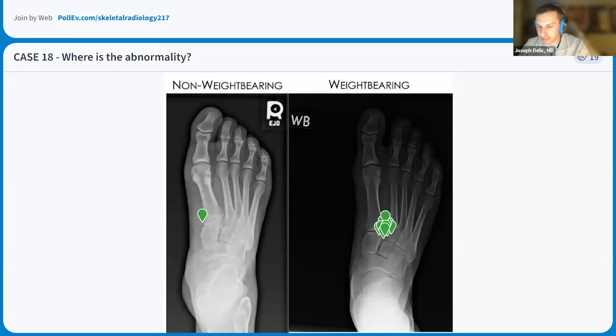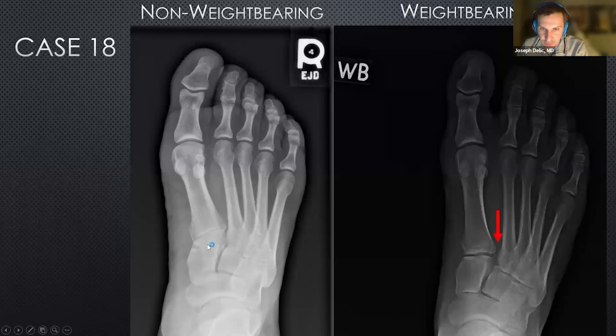Okay. So we look at this radiograph: weight bearing, non weight bearing, right? This is a very important concept to remember. And if we look at these radiographs, what happens here? Well, on the weight bearing views, you get widening of this Lisfranc interval, right? Little step off at the second metatarsal, middle cuneiform articulation, second TMT. If you notice, this articulation looks essentially normal on this non-weight bearing view, but this is perpetuated or exaggerated by this weight bearing image. So this is a Lisfranc injury.